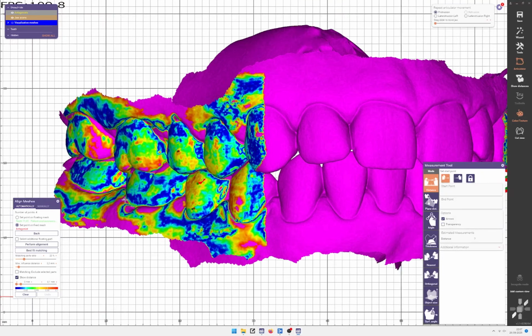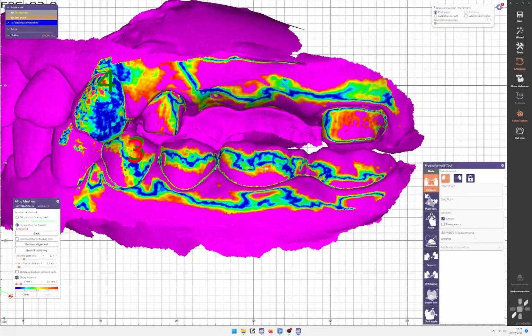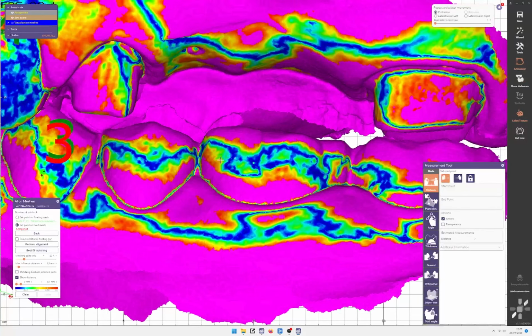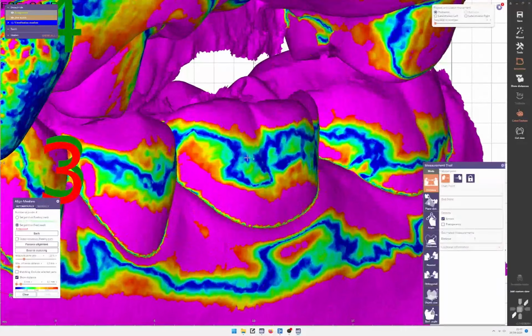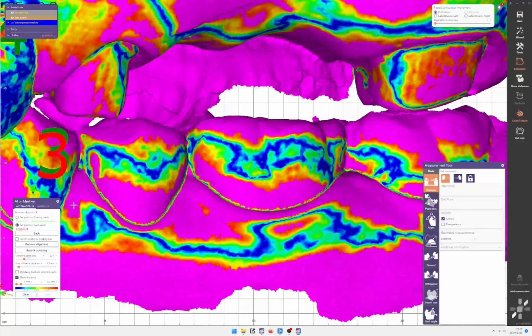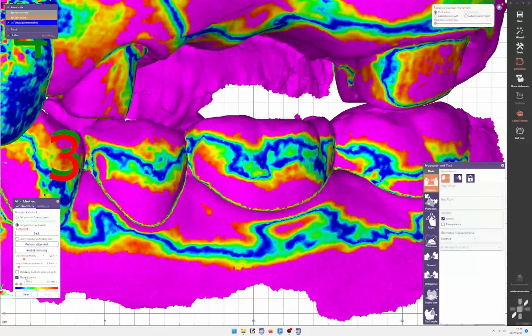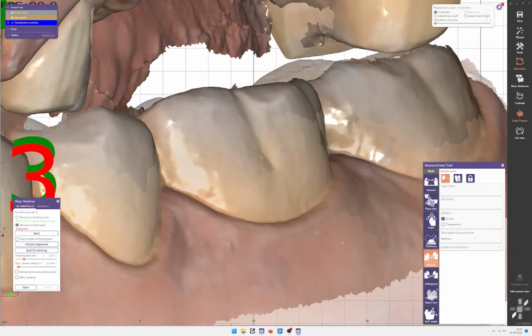Here, this line doesn't tell you it's precise. This tells you that, yeah, the meshes are close to one another, but that's because they intersect. You're always looking for a large area that's in dark blue. So if I hide this now, we can actually measure it maybe a bit more didactically.